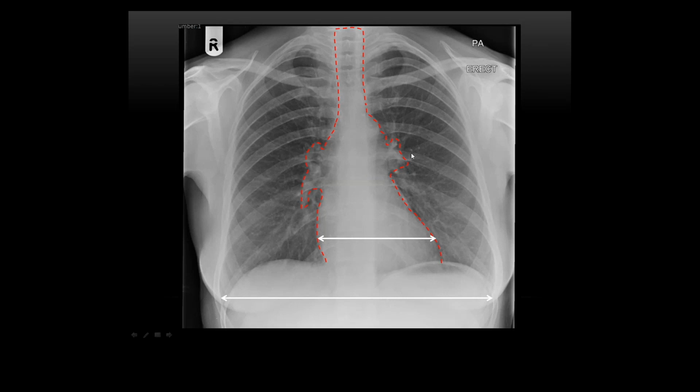It comes up and it loops over the top of the bronchus and comes down behind it. But actually on the right, what happens is it comes straight across like that. So that's why when you look at a chest X-ray, it looks like the left hilum is actually higher than the right one. So it's just anatomical. You get a lot of people thinking that it's the heart pushing the left hilum up, but it's actually just due to the vessels in the actual anatomy.